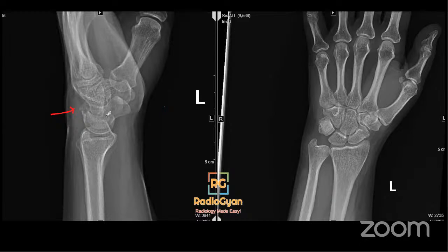So we looked at this. We got happy that this is a pooping duck. This is a dorsal triquetral fracture. But another important thing that we have to notice is that this radial shadow is not really smooth. So you'd see there's a very subtle cortical irregularity here. So we suggested, okay, we talked about the triquetral fracture, but we did not comment anything specific on the radius part. So we suggested, okay, if the patient continues to have symptoms, we should do a follow-up.